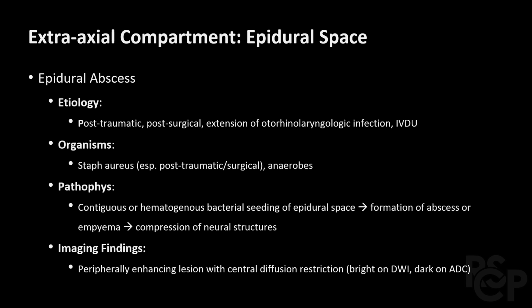For imaging findings of epidural abscess, we typically see a peripherally enhancing lesion that centrally restricts diffusion, meaning that it will be bright on DWI, or diffusion weighted imaging, and dark on ADC, which stands for the apparent diffusion coefficient. So bright on DWI, dark on ADC, with peripheral enhancement.